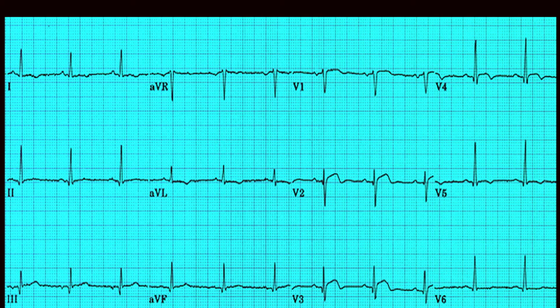That's about the axis. Then this is another ECG example of myocardial infarction. Now you look at the ST segment and the T waves and any pathological Q wave in any of the leads. If it is there, then you think of the other leads which are looking at that particular area, and you try to look for those changes. In this ECG you can see there is ST elevation and coving in lead V1, V2, V3, V4 and V5. So it is an anterior wall MI.